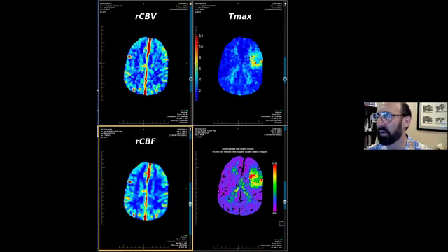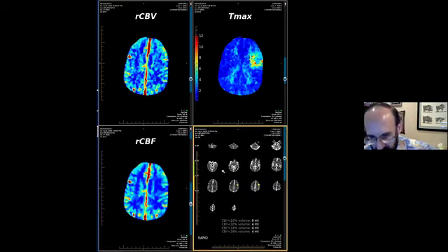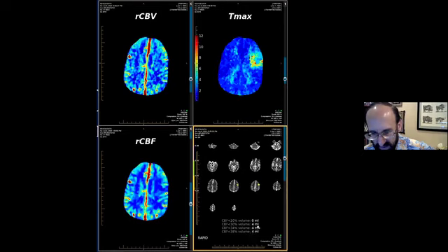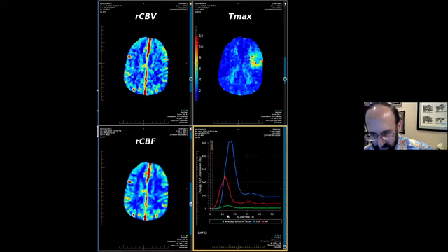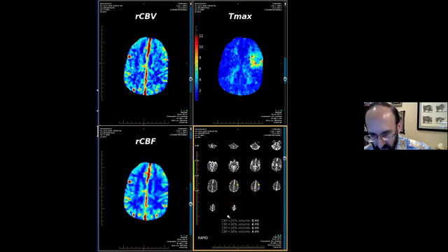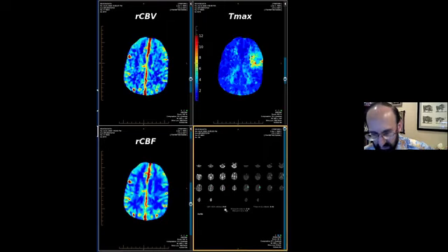So let's go with the first question. Let me see, this might be what I'm looking for. So this is the rapid analysis. You have the Tmax analysis. You have the CBF analysis, and then you have the mismatch volume analysis. So let's go with the first question, Ashley.